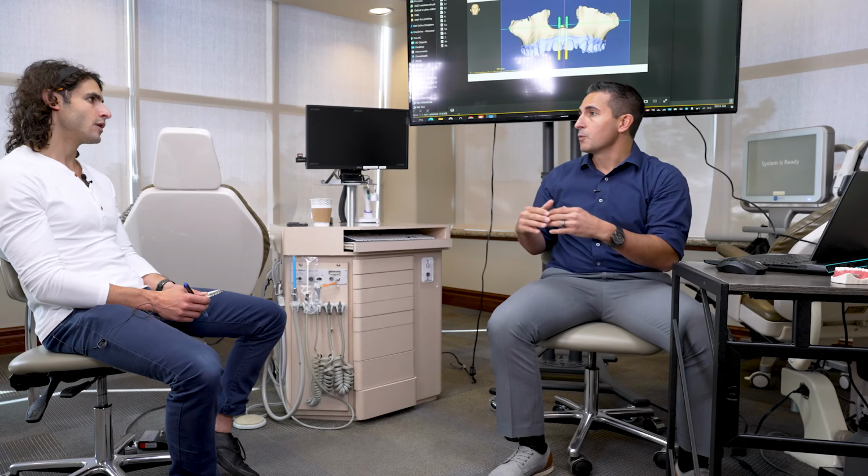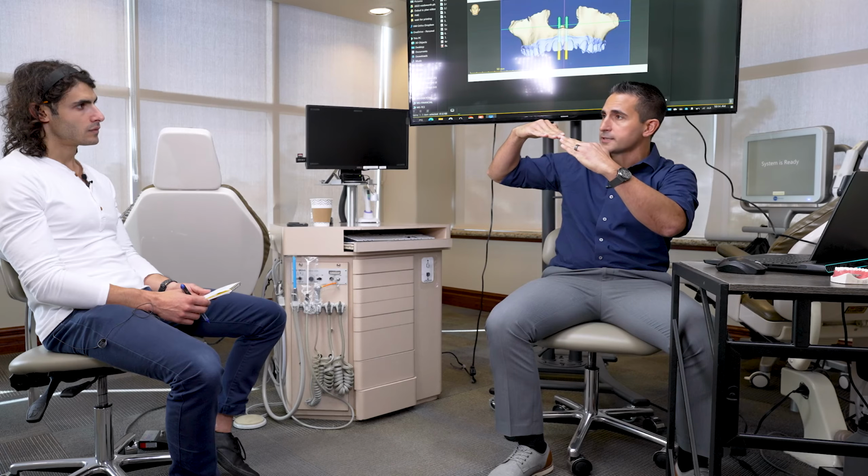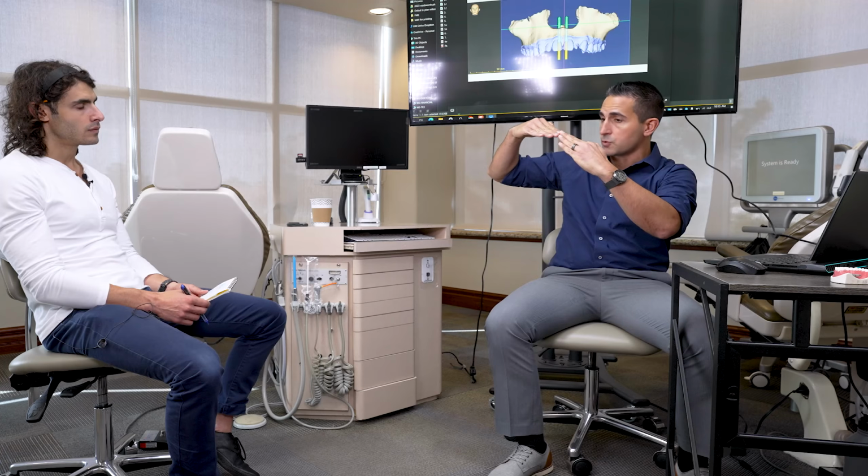Yeah. Well, I'll back up a little bit. One of the things that is fairly well known in this space is that if you have an existing cant, it gets better or worse with MARPE. Generally worse, right? Right. Well, the reason for that is as you're expanding, two things are happening. The jaw's coming down and forward. And if there's any asymmetry, the actual forces of the appliance, if it's placed relative to where the palate is and the occlusal plane, if both are slanted, even if you expand it perfectly symmetrical, it's going to look worse because it's coming down. But if you get any asymmetric expansion, the jackscrew itself in the middle is pointed down on this side, up on this side. It's going to make it even worse.